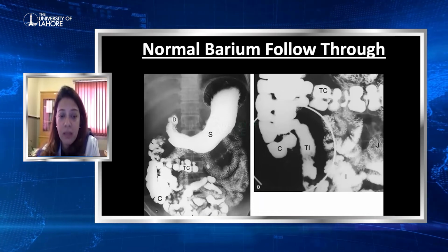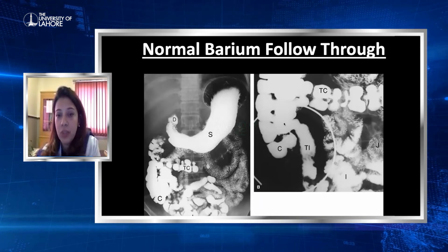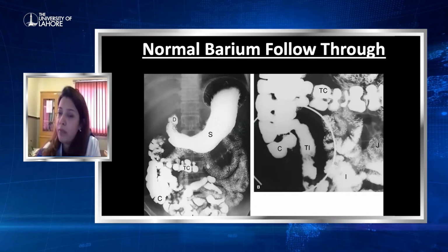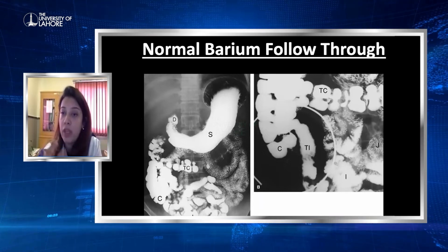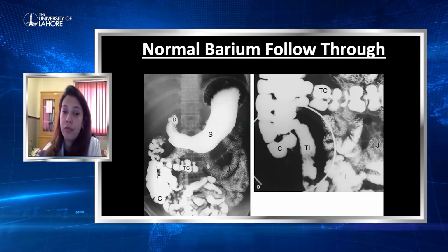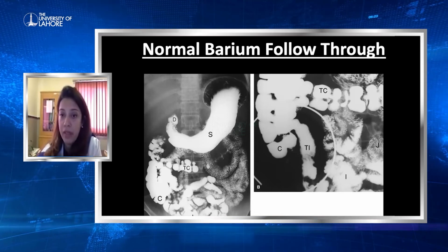This is the ileum, colon, and here, see, this is the ileocecal junction, which is being magnified, right? So this is how it looks like, and it takes a lot of time. The swallow and the meal are done in about 15 to 20 minutes. But as we know, when we eat food, it takes a lot of time for the food to go from the stomach to the intestine to the large gut. It takes about 1.5 to 2 hours. So this is a lengthy procedure.